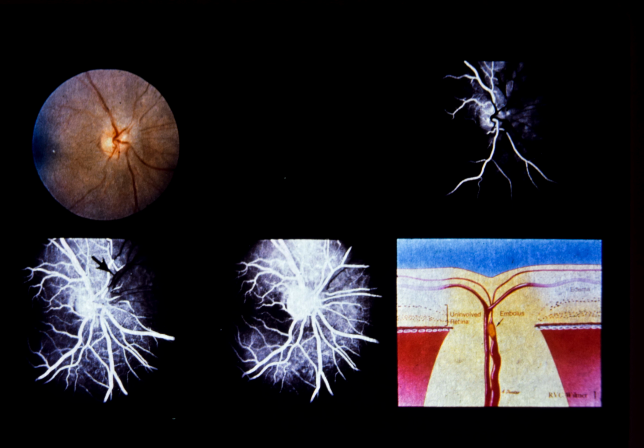Two weeks later, she again noted sudden and total loss of vision in the right eye, but this time vision did not return. Acuity was bare light perception right eye and 20/20 left eye. Upper left, note acute central retinal artery occlusion with white edematous retina. Major retinal vessels are partially obscured by retinal edema. Central retinal vein is partially dilated.